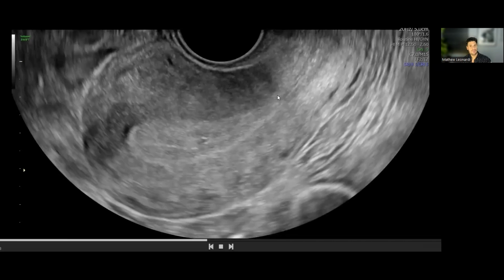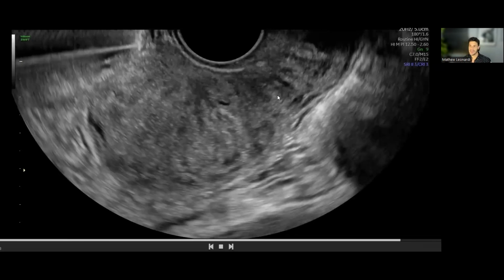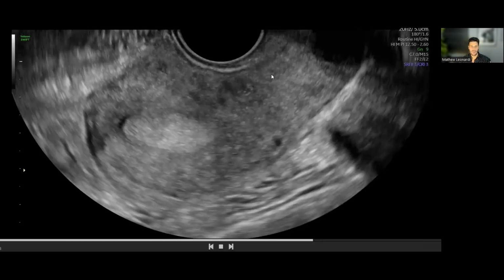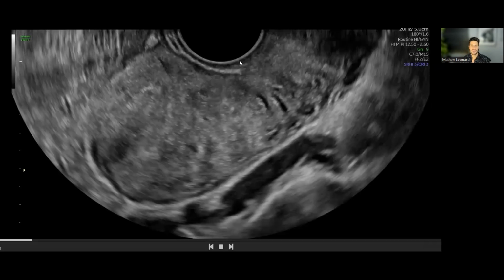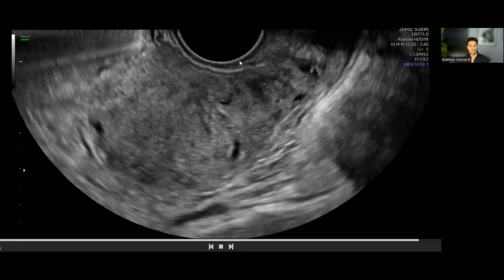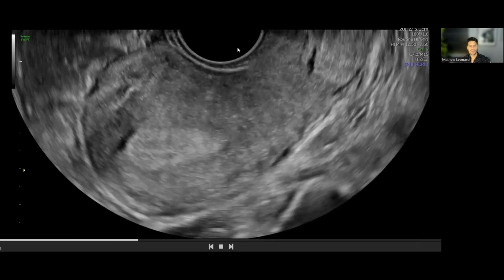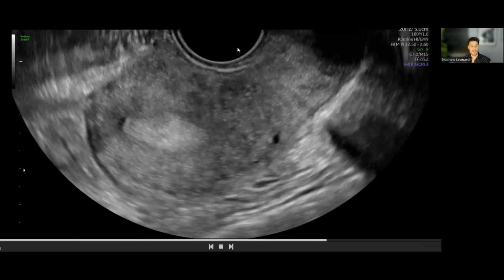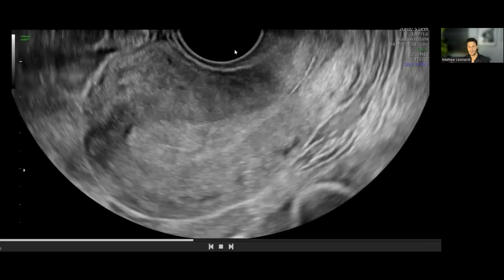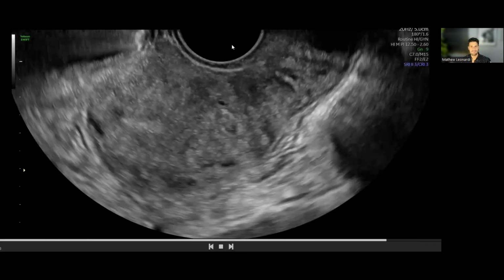If you're unclear about the presence of a polyp, and sometimes you are, because they can be very hard to see, then I think it's a great idea to recommend it to use as a tool diagnostically, but pre-hysteroscopy. Hysteroscopy is a bit more involved, a bit more expensive, and so making sure that you're going to send people appropriately to hysteroscopy is key.